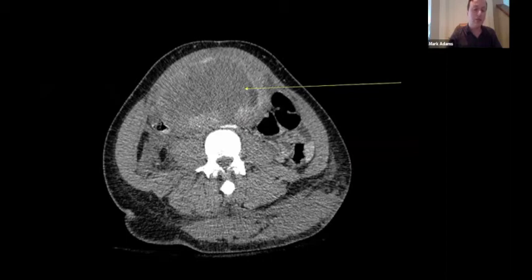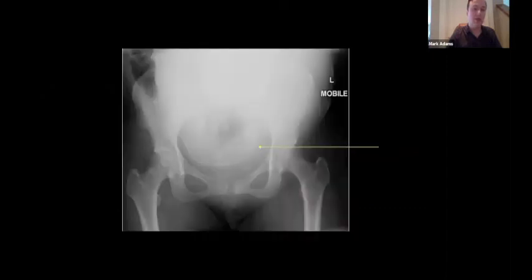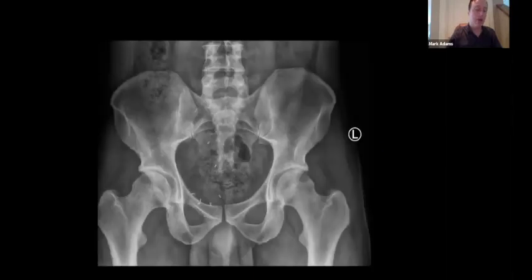In this example, not only would this large fibroid complicate work about the anterior pelvic ring, but this large Morel-Lavallée has implications for work about the posterior ring. Sometimes our pelvic ring injuries can show up pregnant. Now on this example, our eyes may be drawn to those cam lesions bilaterally, but if you note, this patient has staples, and those indicate that he had a previous laparoscopic hernia repair with mesh.